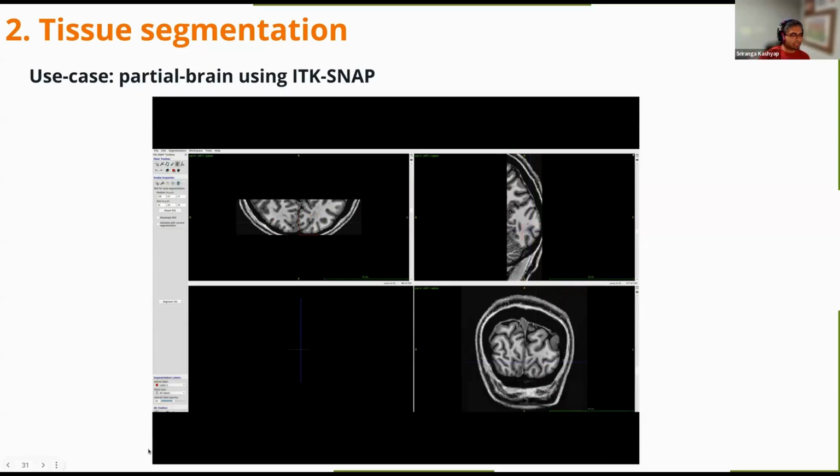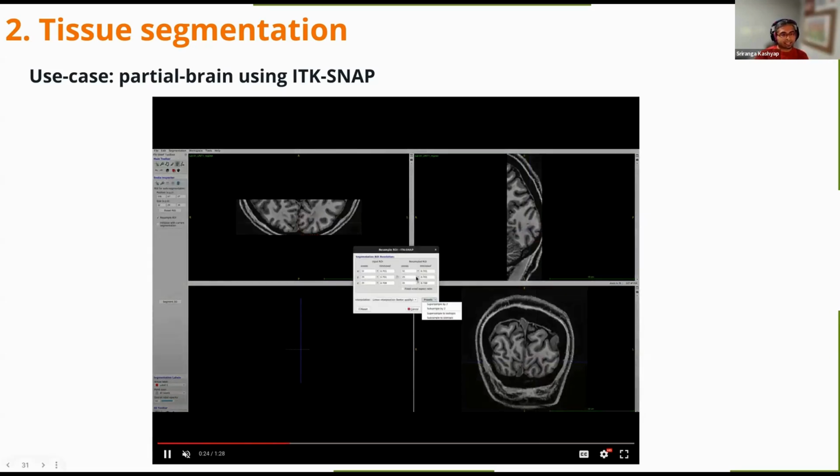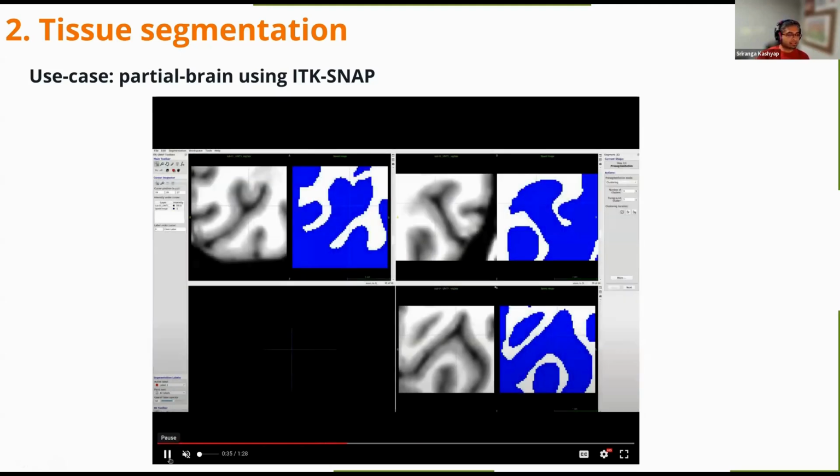And now what you can do is again click on the special flag here called resample ROI. What this allows you to do is, for the sake of segmentation, really upsample your data set in the GUI itself. So you can say I want a 2x upsampling. If you have a 1 millimeter data set, you say I will segment this at 0.5. And in this case, it's 0.7. So I say I super sample by 2 times. And now the data set is 0.35 millimeters isotropic. And it neatly takes you to only the cropped region that you want.